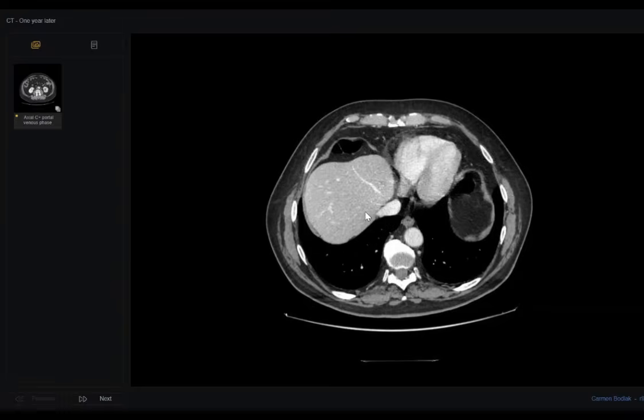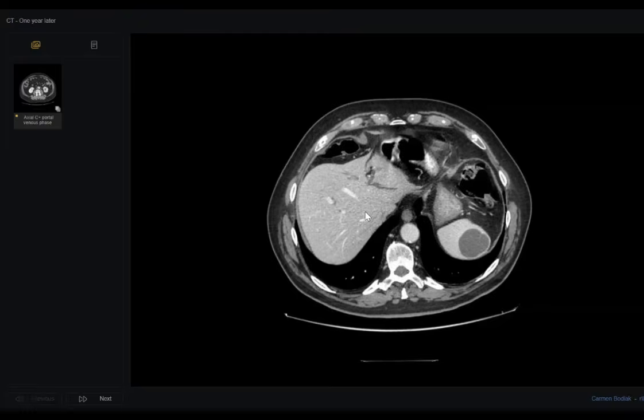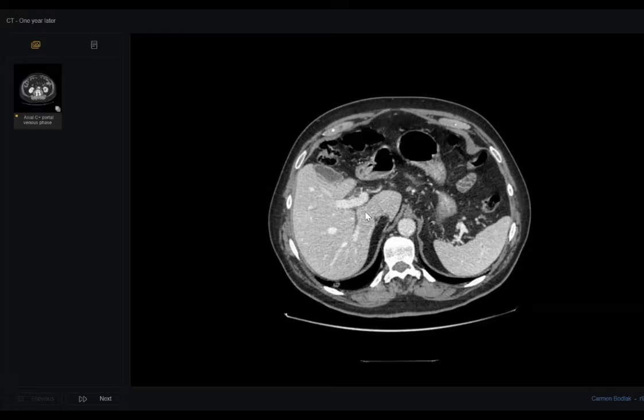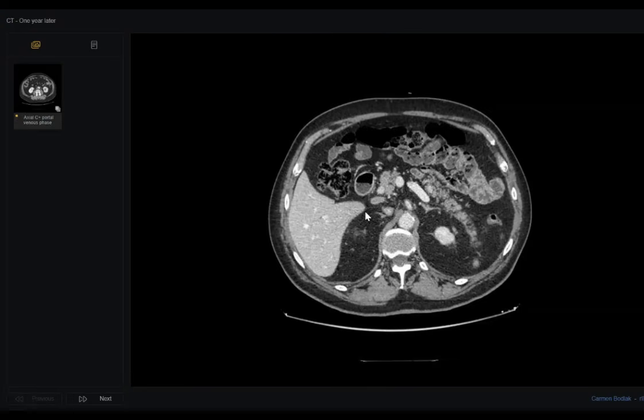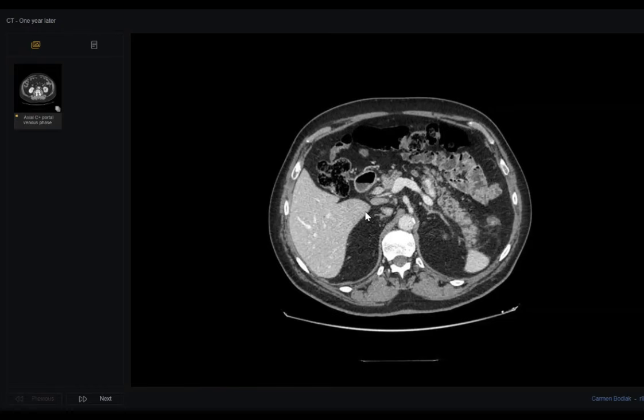Look here. There is some intrahepatic biliary radical dilatation. Why? This could be primary sclerosing cholangitis, and it is also within the scope of IgG4-related disease. I don't know if there are serum markers for the activity of this disease. Did you find any clue, doctor?